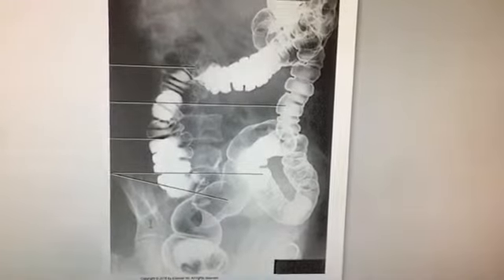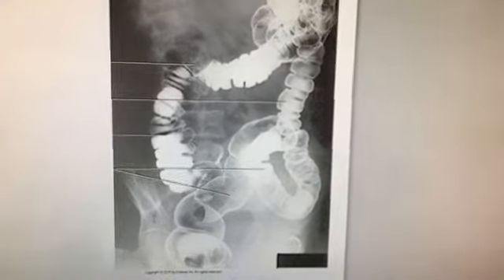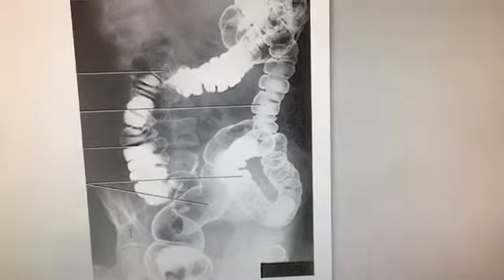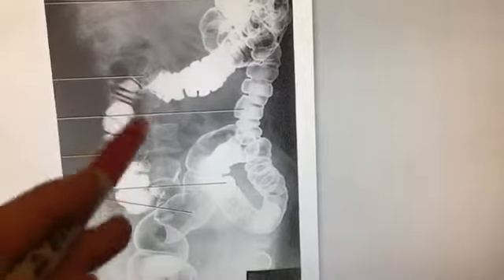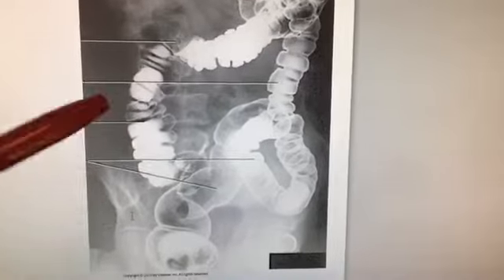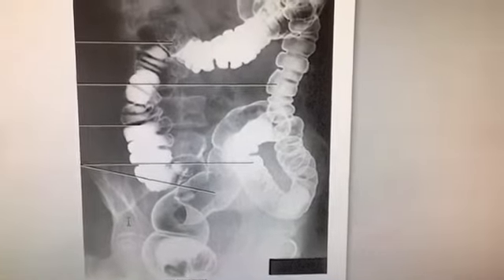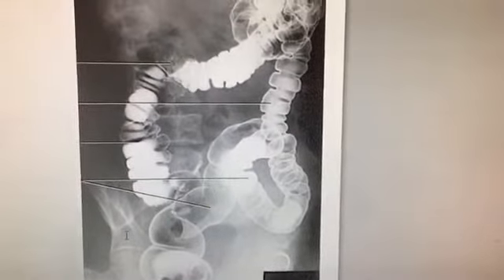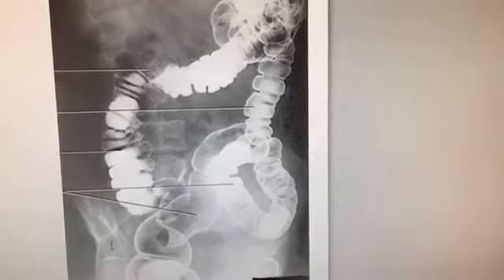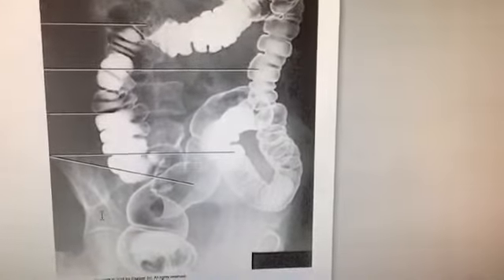The next image in this series will be the PA oblique in the right anterior oblique position. Looking at the lumbar spine here, you can see the Scotty dogs are facing our anatomical left, which is that way. For this one, the right colic flexure is going to be open, so there's not going to be any superimposition in the flexure.